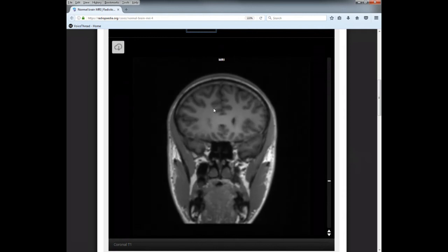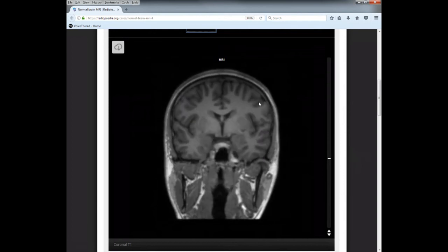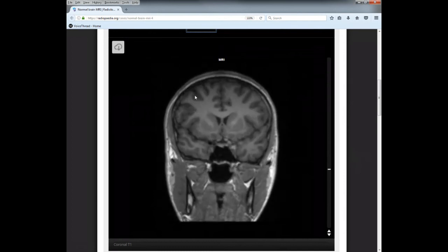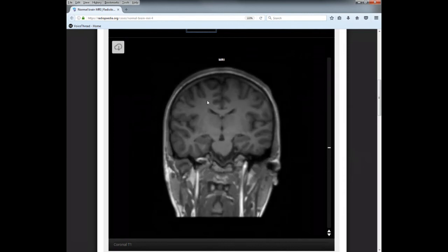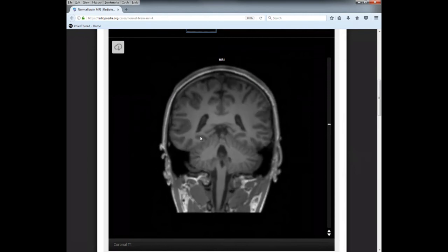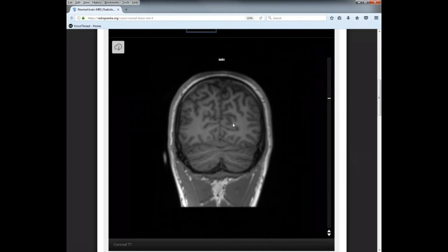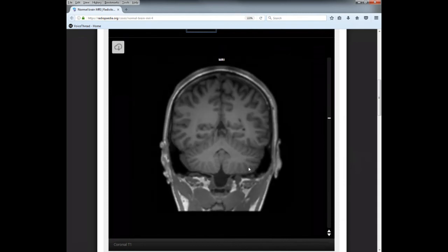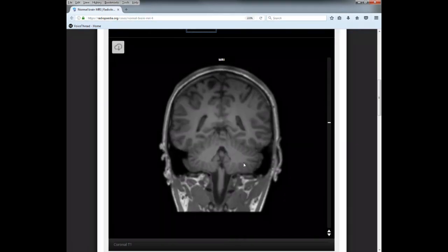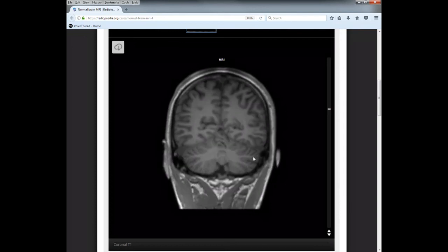But then once you get back to a certain point, I'm getting into parietal, but not being a radiologist, I don't know exactly where that transition happens from frontal lobe, anterior, to parietal, kind of in the middle. And then definitely once you get to the back here, these are your occipital lobes. Occipital, back here. Okay. And then cerebellum down here. This is cerebellum here. Okay, 2 lobes of the cerebellum.